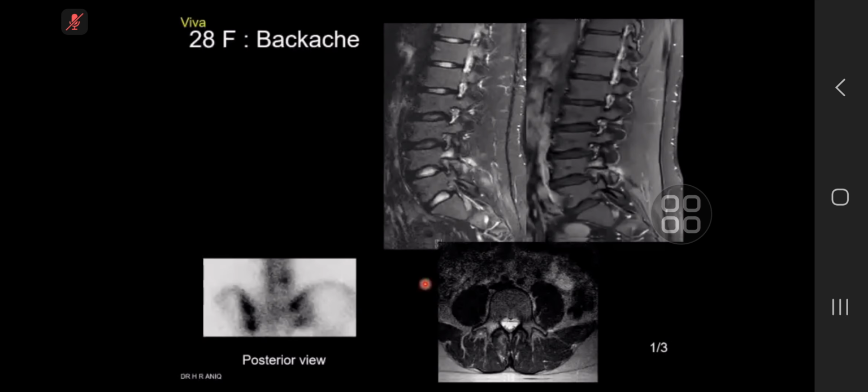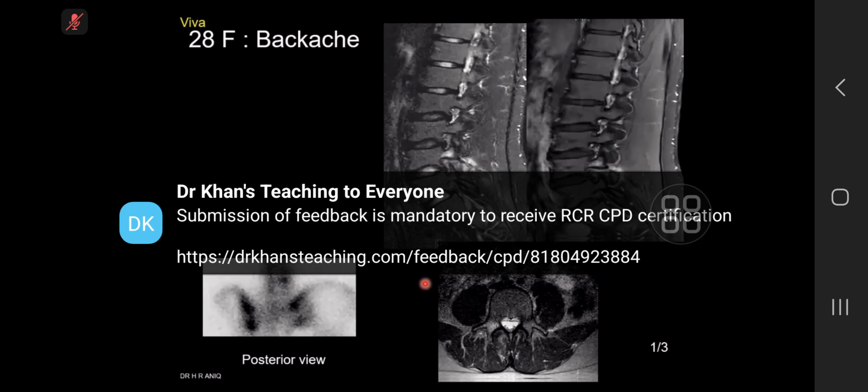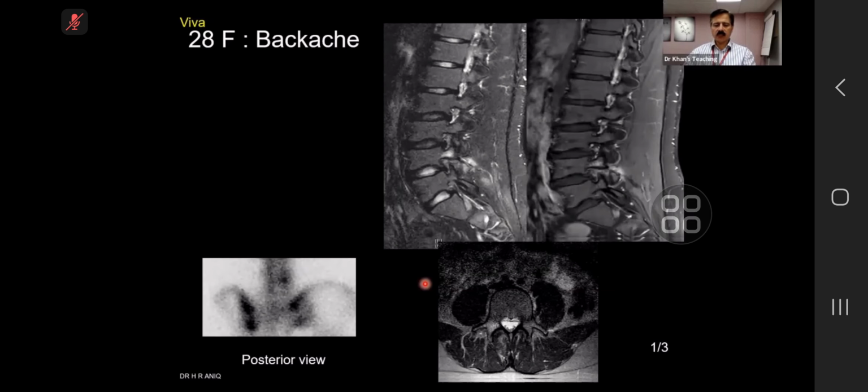It could also be post-traumatic change, so maybe like a pedicle fracture. So which kind of pedicle fracture again? You remember? Like a pars defect, sorry. Yes, pars defect. So please remember, just like your tibia here, the main savior for you is the CT scan.